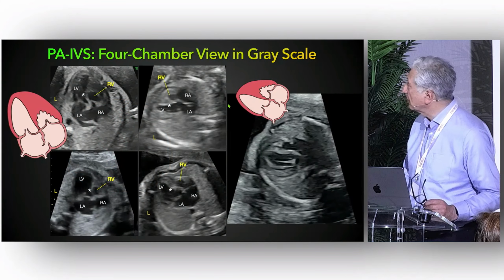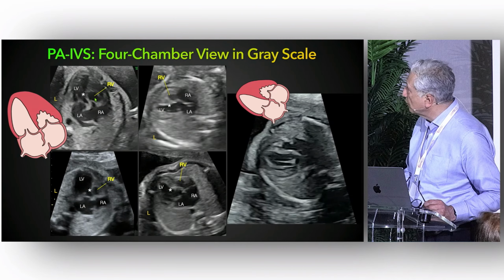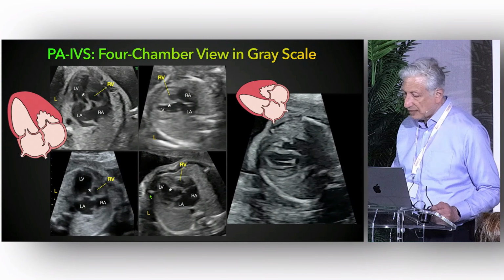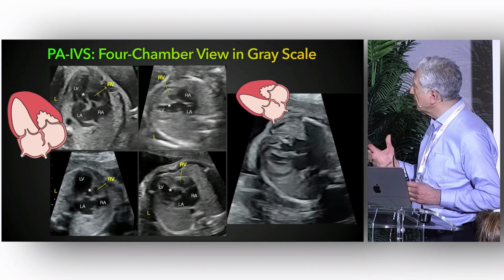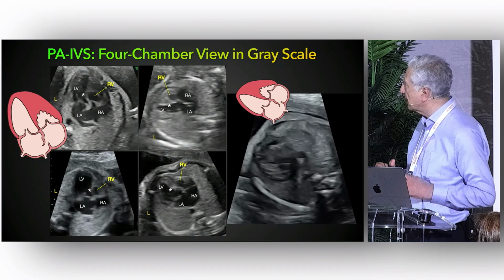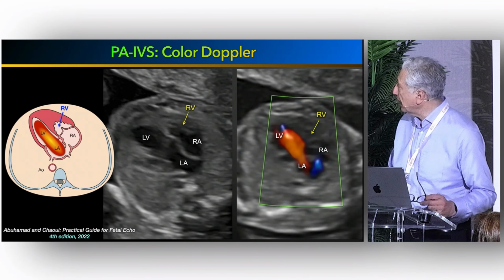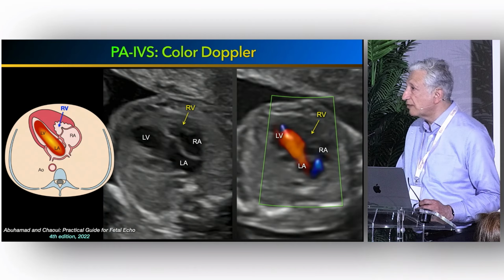And this here, how it looks like, I put an asterisk on this, and you see this bulging due to the more circular shape of the right ventricle in these small cases. It is an obvious finding. And you see here on this video clip how it looks like. You see a non-contractile right ventricle, a quite short right ventricle, a slightly dilated left ventricle, and this is the first impression we see. By adding color Doppler, there are 4 findings you may find.